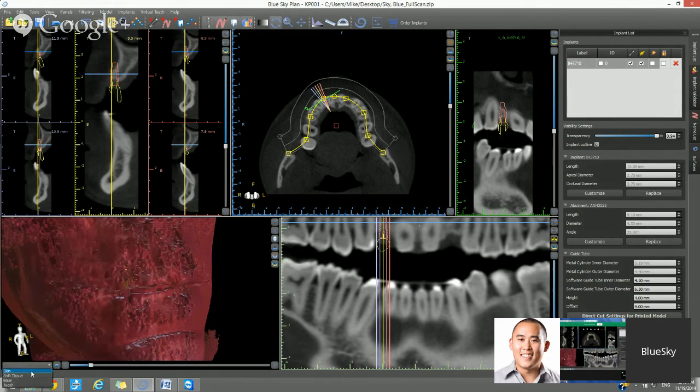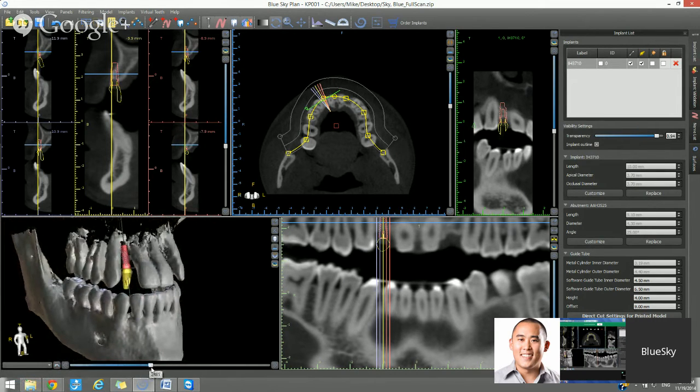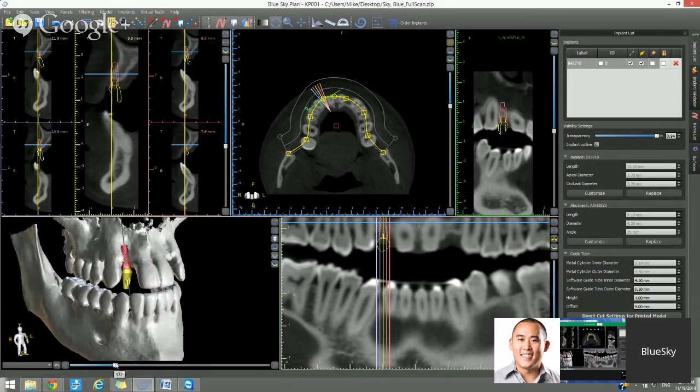The drop-down menu on the bottom left affects our density threshold. It's very similar to moving the slider that we have on the bottom, but what this does is it jumps to presets that are programmed into the software. Okay, so there's no right or wrong, it's just a matter of what density threshold you want to be viewing things at.